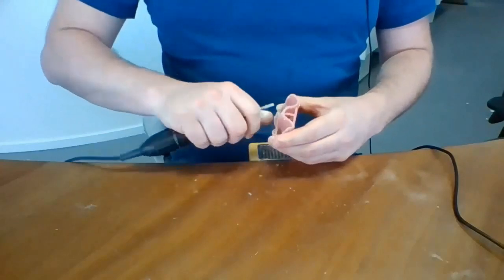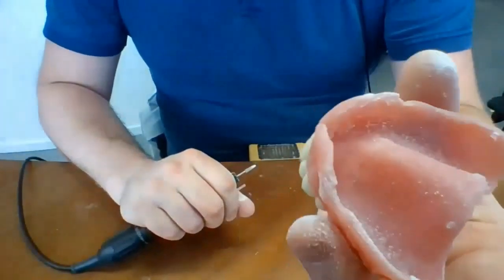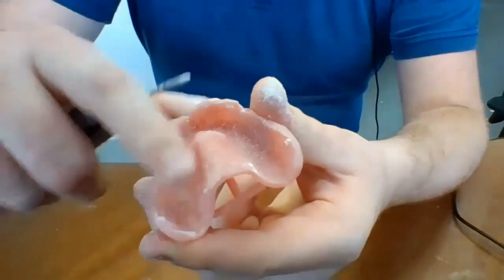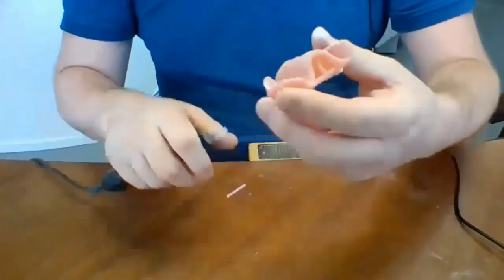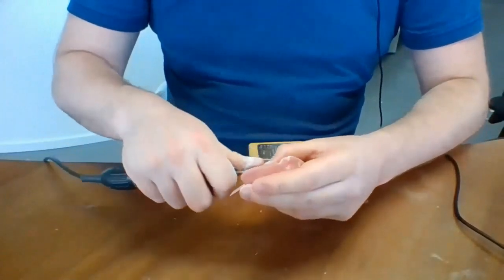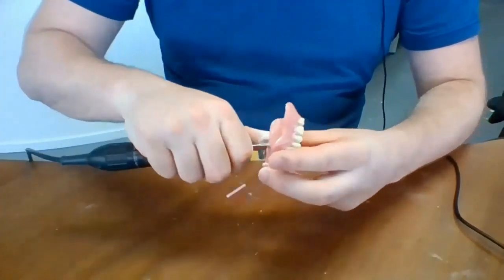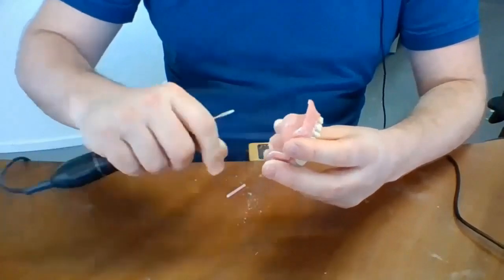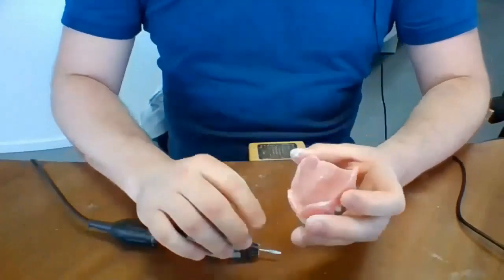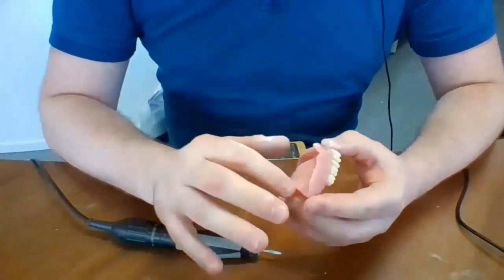Now, if you remove the bars, you will still see a little bit of the scarring of that part, which is also very easy to remove with that tool. Just remove it, feel with your finger that it's gone. You don't want to grind away too much, of course, but it's a very easy procedure to get rid of this. After that, there is actually not a lot of work on these dentures to get rid of, for example, the rest of the supports. They just break right off. There is very minimal support scarring or material left.